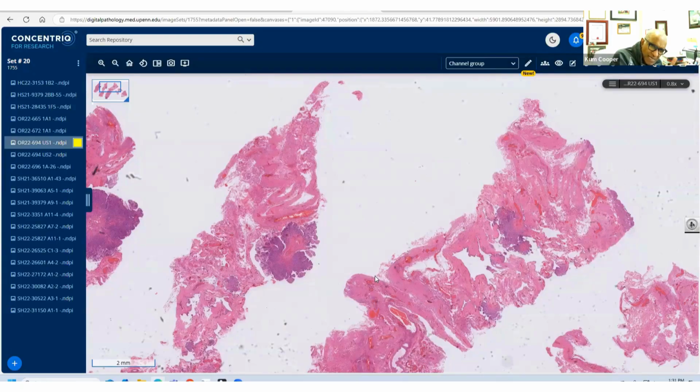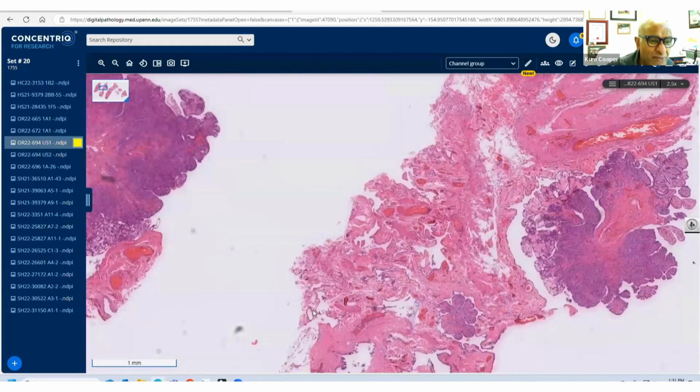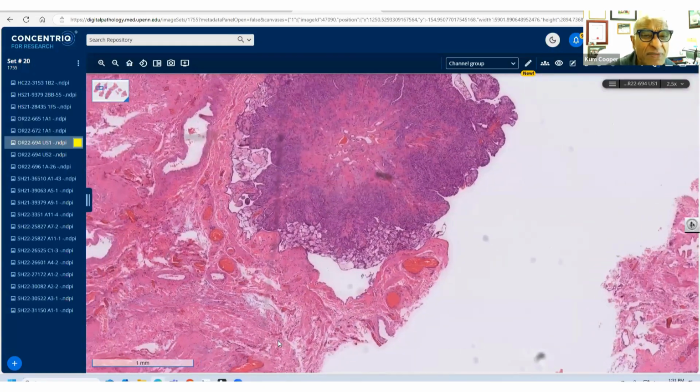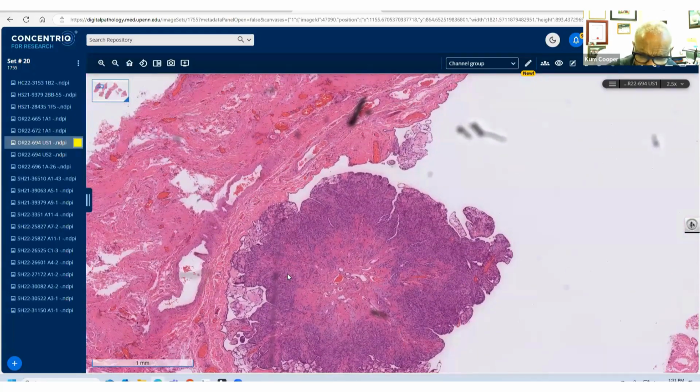So there are 3 reasons why it's not a well-differentiated papillary mesothelial tumor, but instead a multifocal papillary mesothelioma with microinvasion. And like I said, there were other areas where it showed this microinvasion, not everywhere. So that's what we called it.